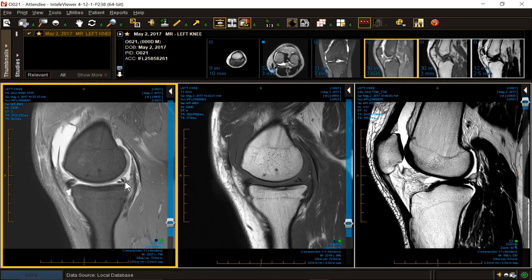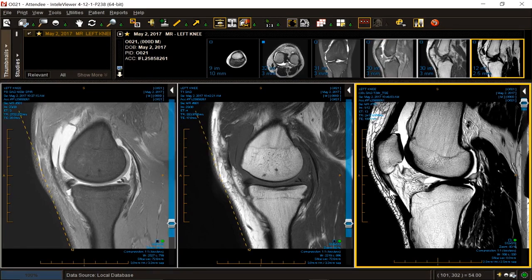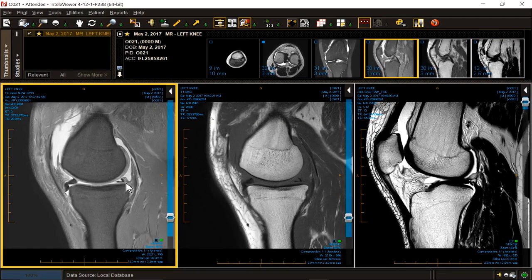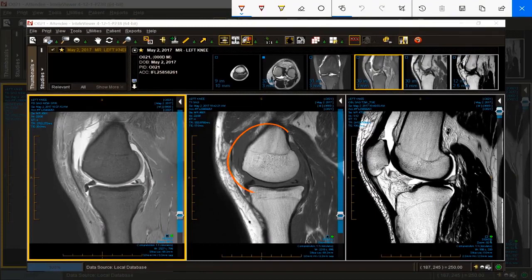Could have been meniscectomized, but it wasn't. That should be your first thought in a 50-year-old. But not in a 23-year-old with a virgin knee and no arthroscopic tracts. It went somewhere. It went here. It went in and forward. So we can do something like this. We said we would talk about the shape of meniscal tears. Let's do it.